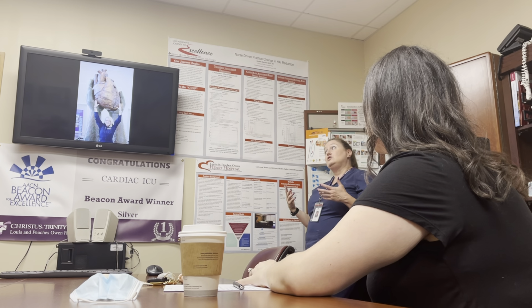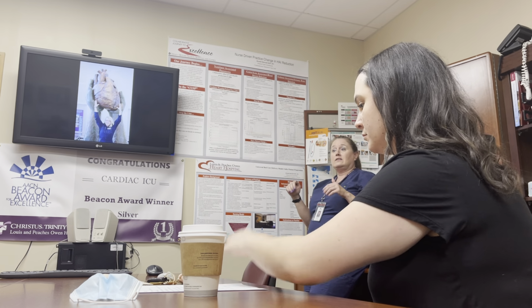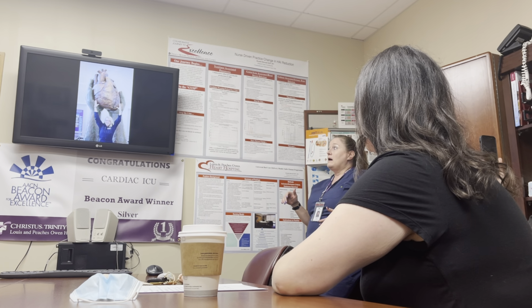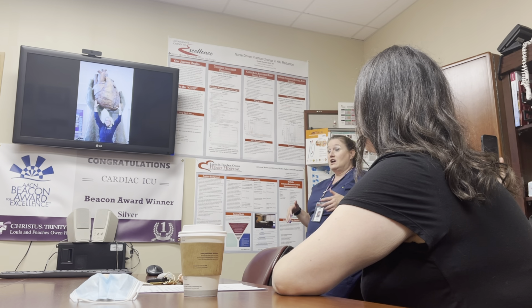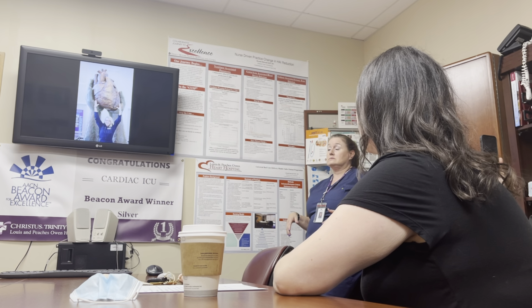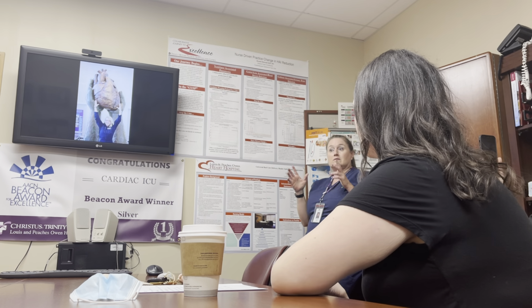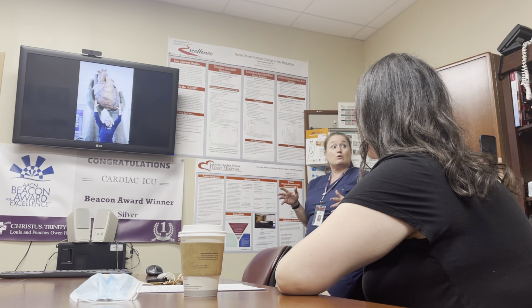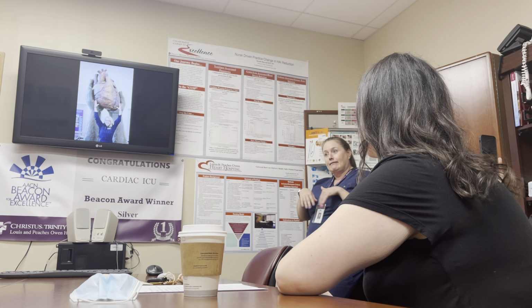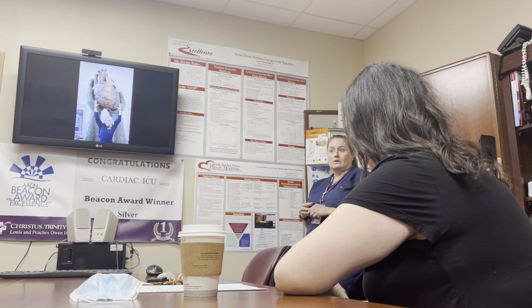So those are the things that you can at least look at on a chest x-ray and say, hey, you ordered this, this is what I'm seeing, can you take a look and confirm what I'm seeing? Or you can say, hey, we got this x-ray, something's wrong, and I still can't put the pieces together, can you look at it or come help me? That's what I wanted you to get from this lecture: a basic way of looking at the x-ray, an organize-your-thoughts way, rather than going straight to the heart, because this is the heart area, and the lungs have to play in the same sandbox as the heart area. But there's a lot that can go on in the chest, as you all can see.